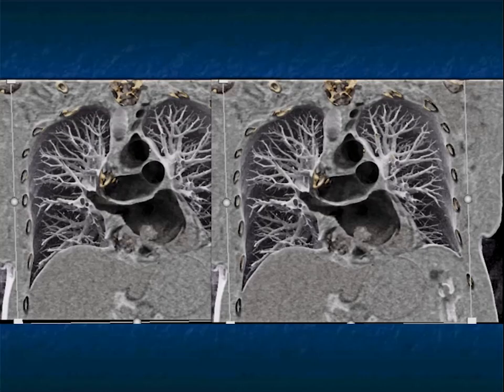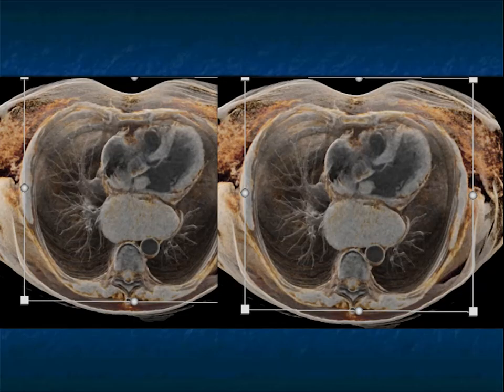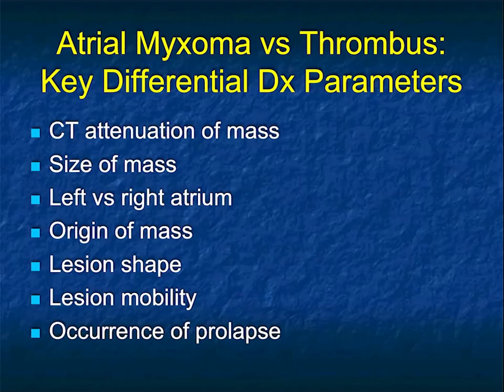And here it is again, you can make some really, really nice images, but I think it really accentuates the point that it's a broad-based lesion on the wall of the left atrium, slightly irregular, intraluminal, classic for atrial myxoma. And here's just one more set of views.